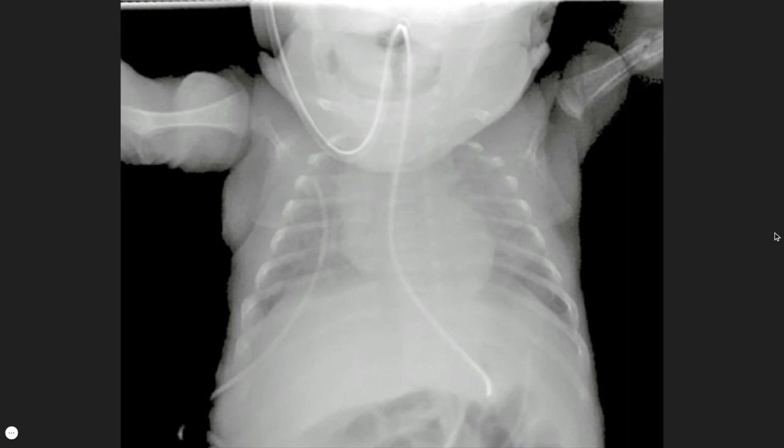Pause the video again and have a look at this chest x-ray performed to check nasogastric tube position in a baby who's presented with failure to thrive. Here we have less information on the image than on the previous study. It is a presumed AP view of the chest. The image is technically suboptimal as the chin obscures the superior mediastinum, upper airway and lung apices.